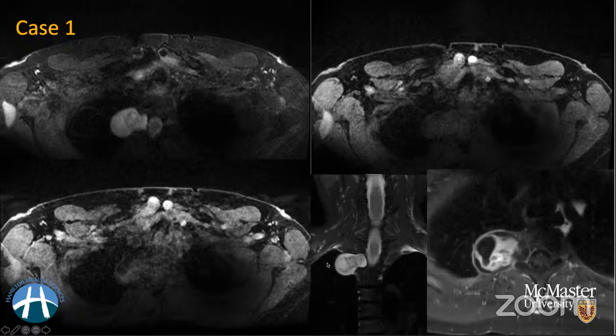There are so many areas in the body where you can have target signs. You can see target signs on ultrasound in the liver. You can see target sign on gadolinium enhanced MRI in the brain. This particular appearance is specific to T2-weighted imaging, where you see a peripheral rind of high T2 signal, and the central portion is usually heterogeneously hypointense. This is quite specific to schwannomas.